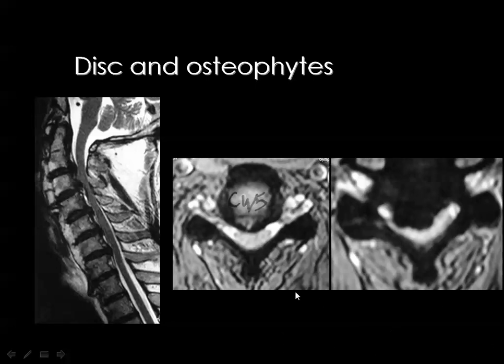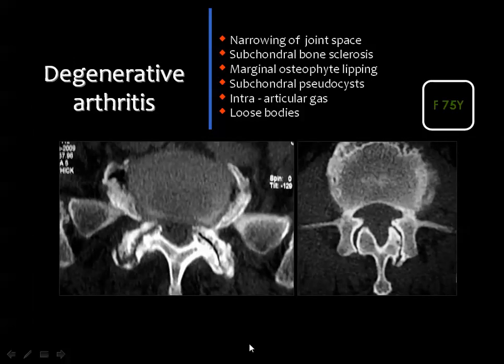Actually, this terminology is no longer used, but we can safely say that this disc is associated with osteophyte, or associated with traction osteophyte, and we should include this in the report for the surgeon to be ready to remove the disc as well as to remove the osteophyte. Then we have anterior osteophytes, which are of little significance, and posterior osteophytes, which are more important.